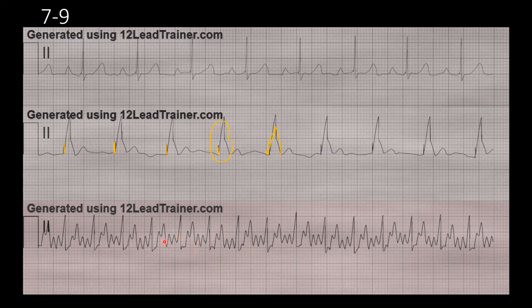The rate is about, let's see, using this one, it's about 300, 150. Yep, just 150, maybe a little bit over. If we count and do the multiplication method, 1, 2, 3, 4, 5, 6, 7, 8, 9, 10, 12, 13, 14, 15. So yeah, about the same. So we'll call this a rate of 150.